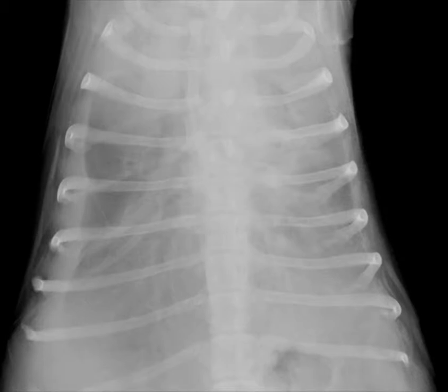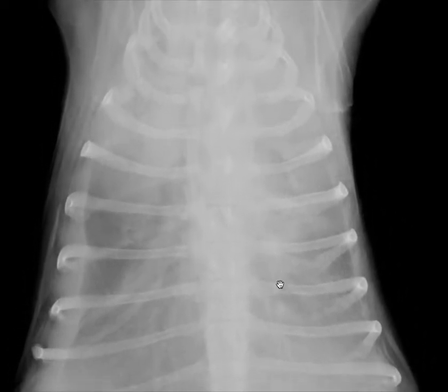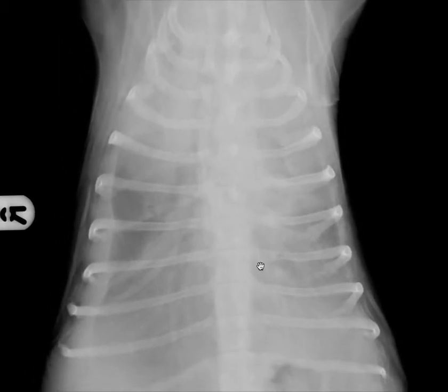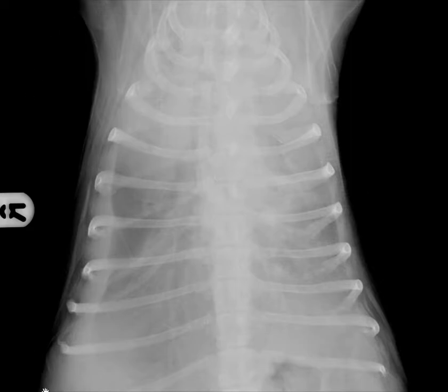So we've been talking about lung patterns over the last couple weeks, and this is actually a kind of special example that I wanted to bring to everyone's attention. I think when we first opened the case, we can all agree about a few things. One, there's an overall increased opacity in the thorax, and it's maybe not uniform. In the caudodorsal lung fields on this view, I can trace the pulmonary blood vessels, for example, here. Whereas when I look more cranially, I don't see the pulmonary blood vessels as well.